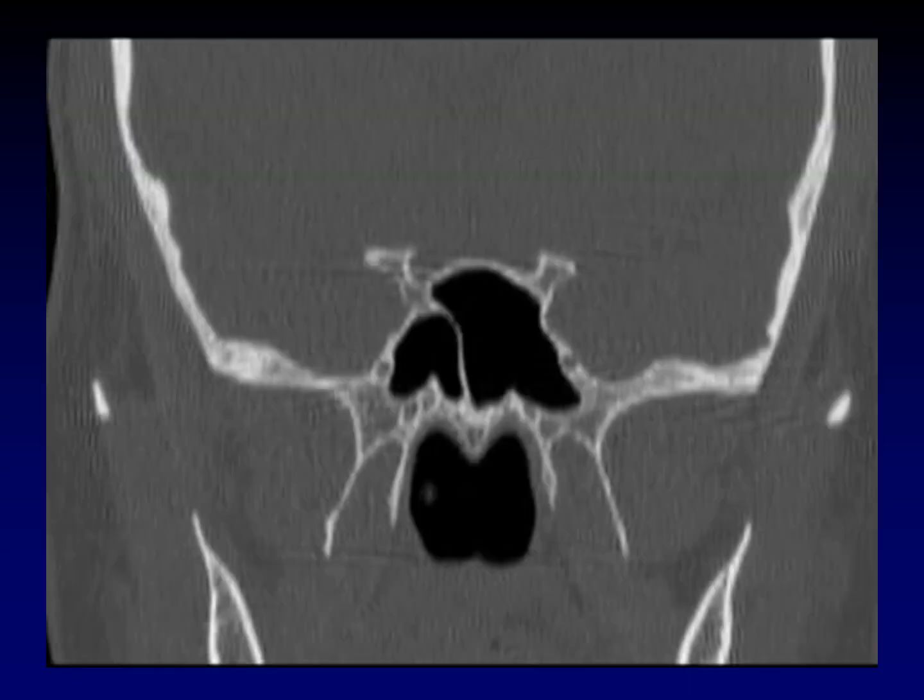This image is one of the classic textbook images from head and neck radiology. This is one that you'll see on tests. This is a coronal image just posterior to the pterygopalatine fossa. And the reason that it is interesting is that it shows the nerves that are going to head in towards the pterygopalatine fossa. In particular, we're interested in this cross-sectional canal and this canal cross-section. And the classic test question here is, which one of these is Vidian's canal and which one is V2, that is foramen rotundum, carrying the second branch of the fifth cranial nerve?